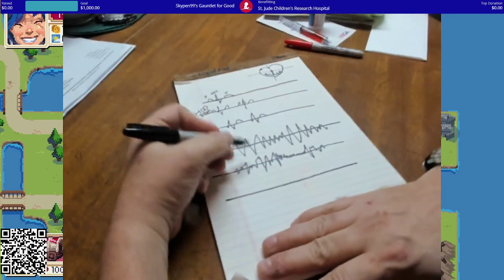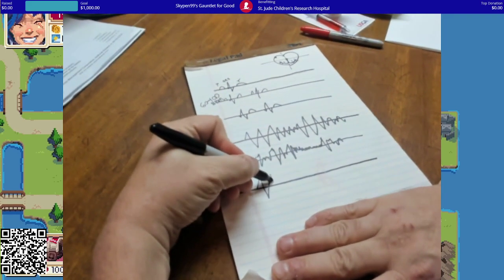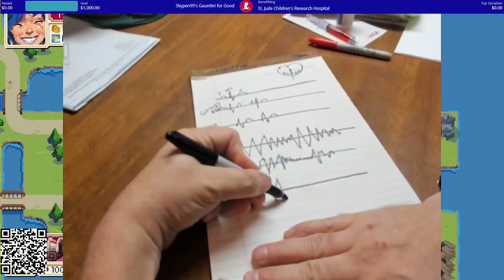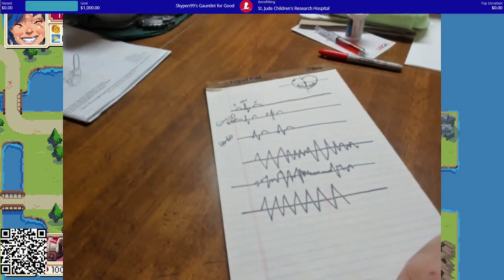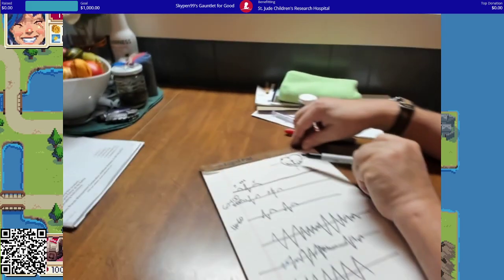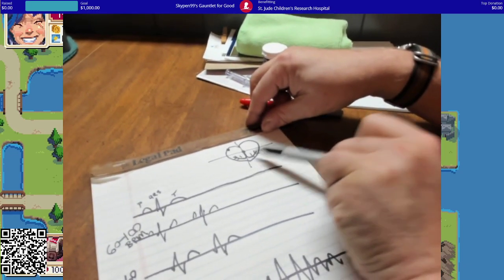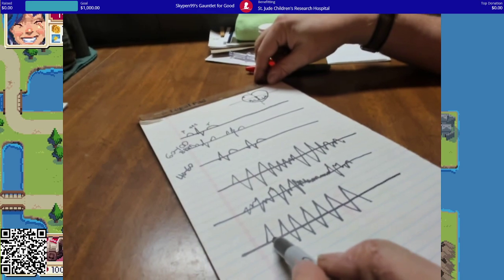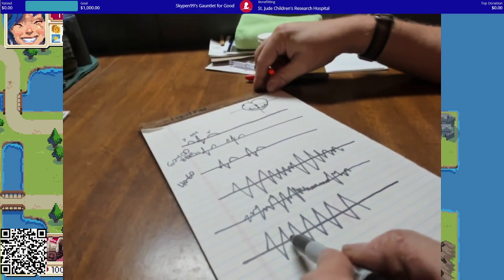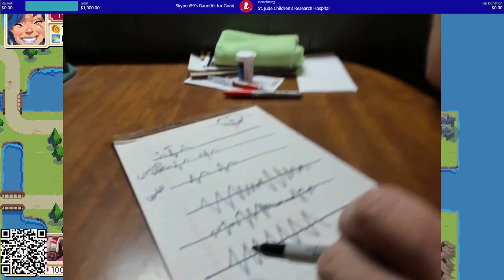And we'll look at a very nice regular one. So what is actually happening here? The beat is starting in the lower half of the heart in the ventricles. And then you're getting one spot here that's firing. And the reason why it looks weird and bizarre like that is because it's propagating upwards.